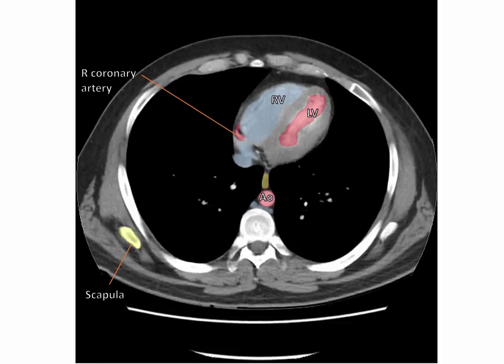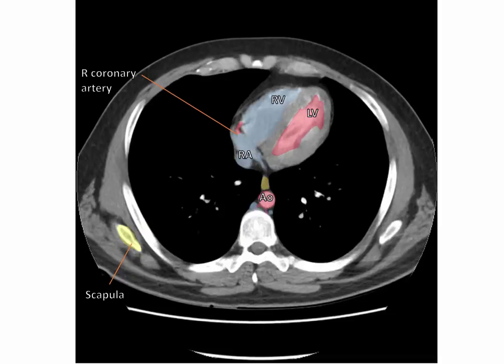As we follow the inferior vena cava upwards, we enter the right atrium. Note also at this level, which is approximately T8 vertebral level, we can see where the hemiazygous vein is draining into the azygous vein on the right here. We can see the paired posterior intercostal arteries, which are emerging from the thoracic aorta here.